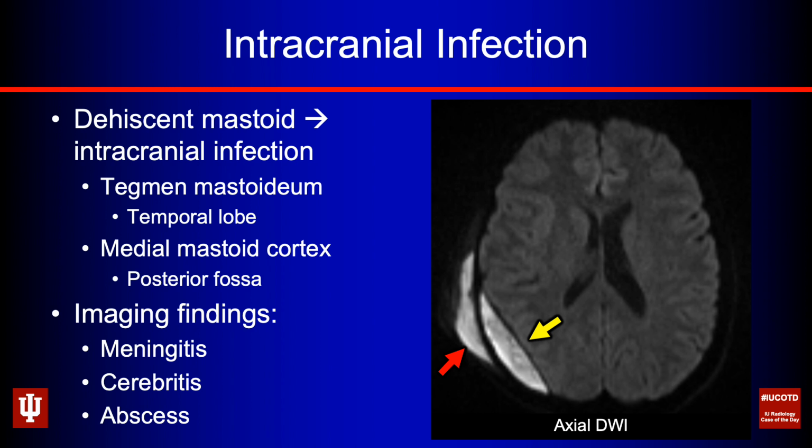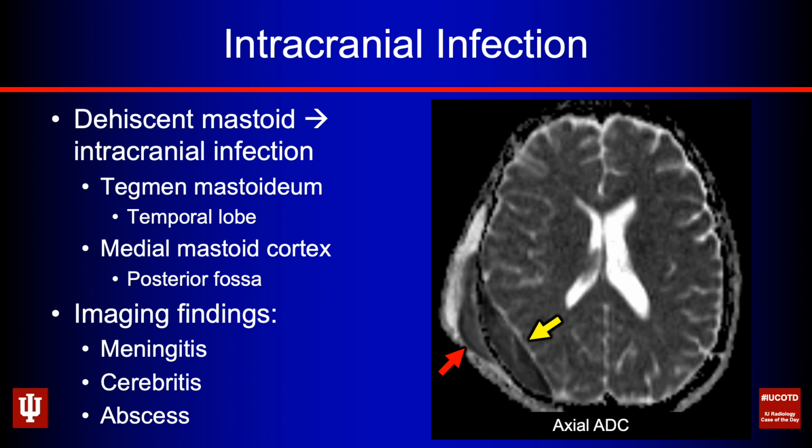Whenever you see that, look at your ADC map, and it's dark. So we can see here that we have both intracranial and extracranial abscesses. And then look at that ADC map. We have that area that's a little bit ADC bright that's extending anterior to it. That's an area that's more phlegmonous on the extracranial surface rather than representing additional abscess. So use those advanced sequences like your diffusion sequence, because that offers more sensitivity, but also gives you more specificity in differentiating where abscess and phlegmon are.